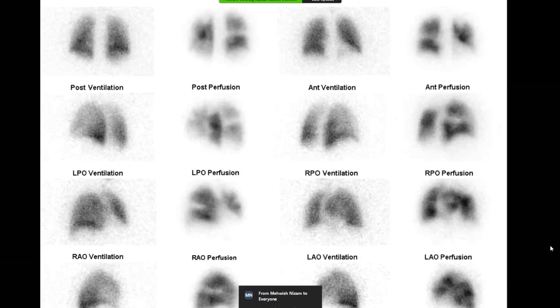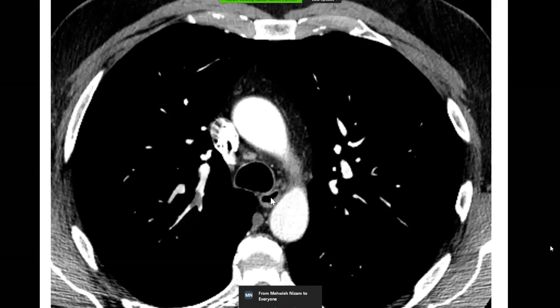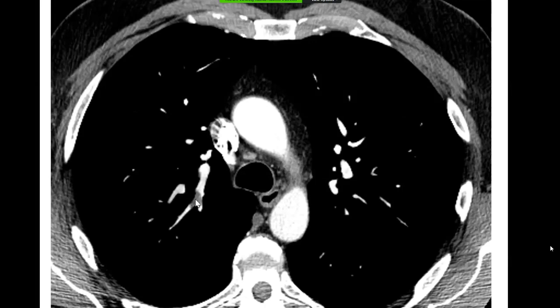If I show you an image of a CT scan which was reported normal. Okay, sir, I'm provided with a single axial image of CT chest with contrast, mediastinal window, and I can appreciate a filling defect noted within the segmental branch of the right pulmonary artery. Yep, so this can be a thrombus. So this was there, and this was retrospective again. Prospectively, it was certainly missed by us. Retrospectively, you can always be very clever.